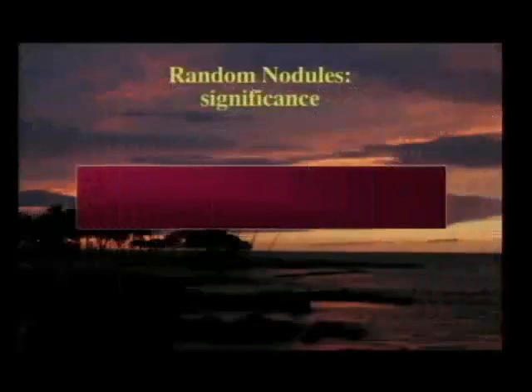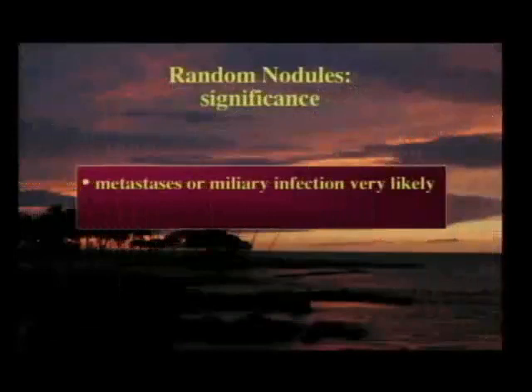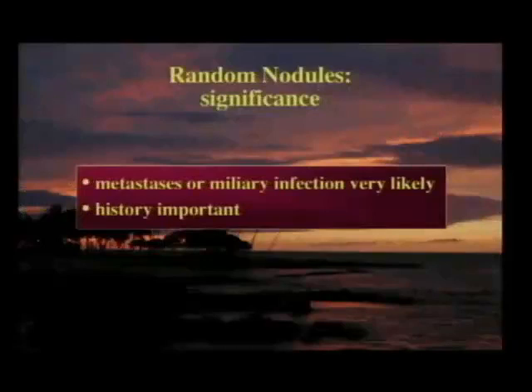So the significance of a random pattern: metastases or miliary infection very likely, and again, history will likely help you in making the distinction between these two.